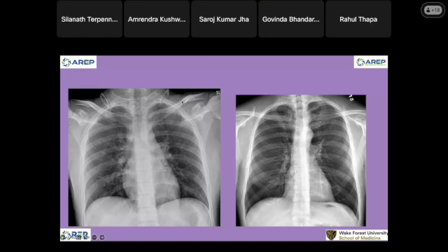This one is an example of hiatal hernia. Right? Good, you pick up the displaced fracture. This clavicle is the fracture. If you look at it carefully, compare the soft tissue at the fracture site. It looks swollen compared to the right clavicle.